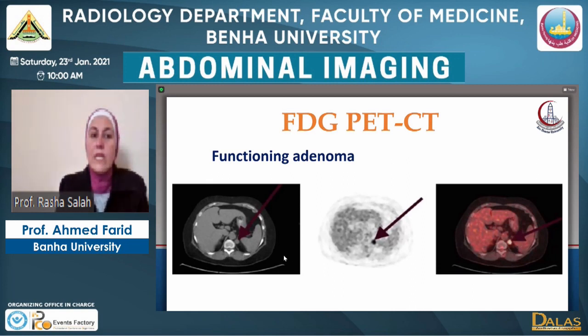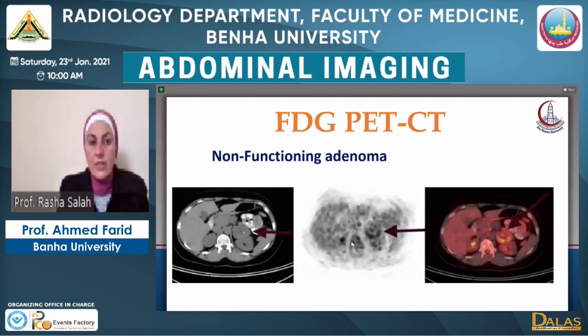And again, we rely on the anatomical imaging of the CT for further characterization if this is an adenoma or a suspicious mass lesion. This is a non-functioning adenoma, and as long as it is non-functioning, it doesn't show increased FDG uptake, and it appears to be of low grade activity like here.